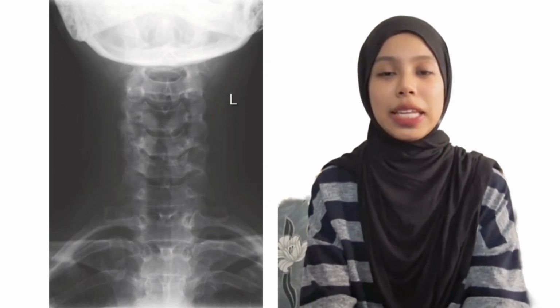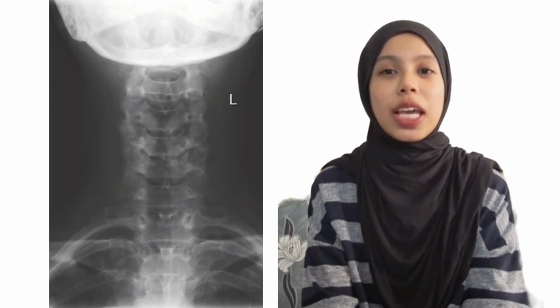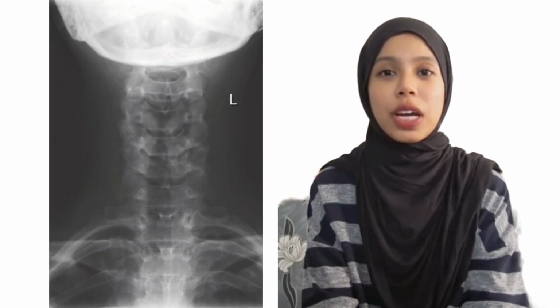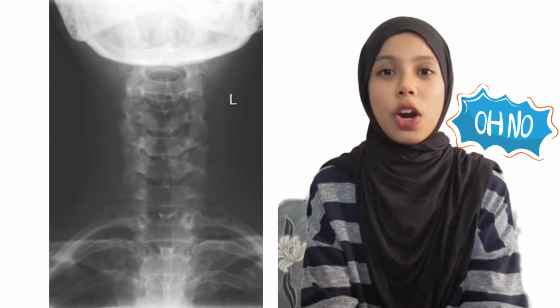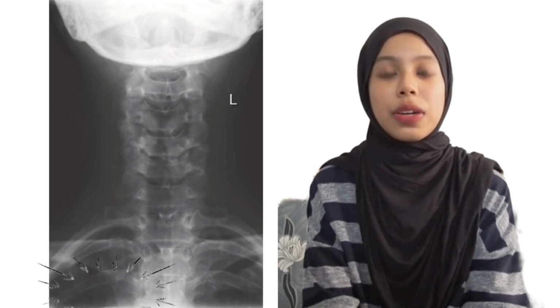Patient's name and ID, date of examination, and place of examination are not present on the radiograph. They should be present on the left and bottom side of the cassette.